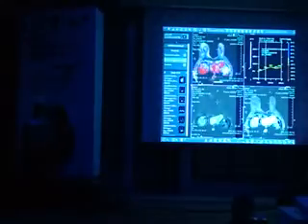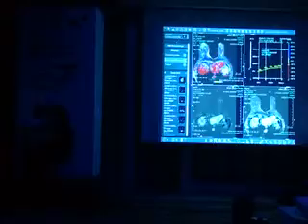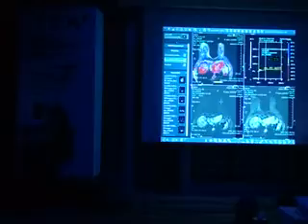And then I can go to this dynamic curve, a very fast way to enhance, just moving my cursor to get the proper curves in a proper way. And of course I can scroll around with all images to see if there is a lesion.